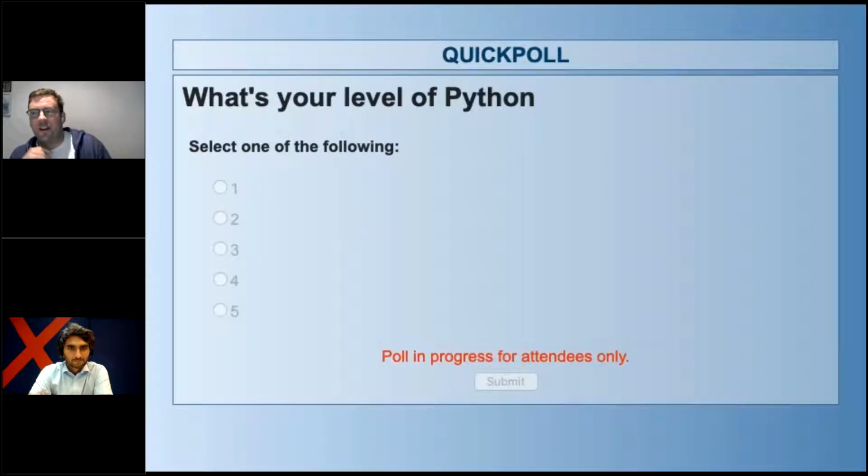Oh yeah, so I'm going to give you a live demonstration of how to use MNE to analyze your fNIRS data, and it's going to be in the language of Python, which is a programming language. I wanted to know, are you a 5 out of 5, an expert in Python, or a 1 out of 5 where you've never used Python? If you could rank yourselves there, then I'll know how to pitch the presentation today.